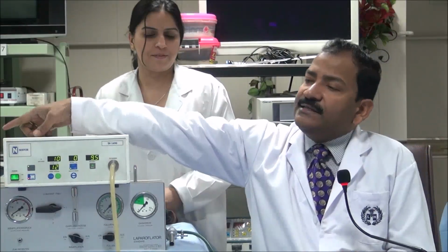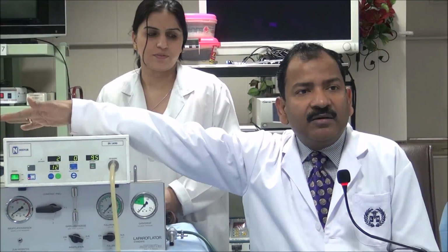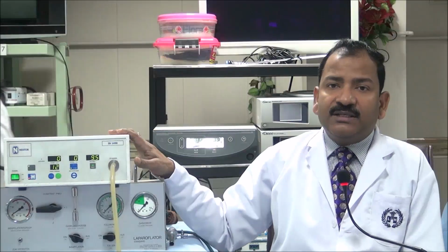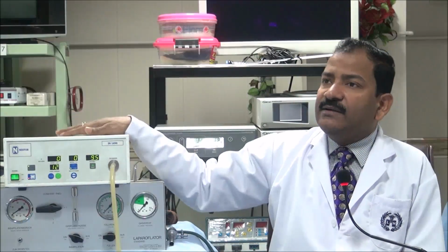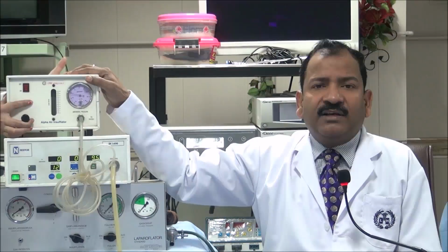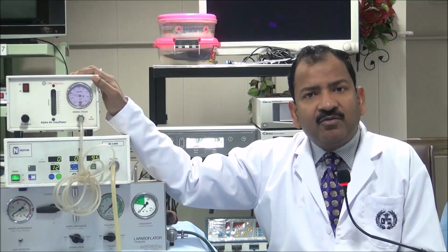Sometimes some people use a nebulizer to push the air. And some air insufflators are available in the market. This is an air insufflator. This is a small insufflator, a very cheap one. It will cost you only 20-25,000. This insufflator will take the room air.